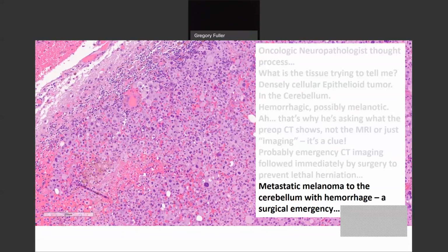A corpus amylaceum, a polyglucosan body in an astrocyte process. You see a corpus amylaceum, you're in neural tissue, brain or spinal cord. You're not in the meninges. That can be huge. Does everyone understand? This is important stuff.